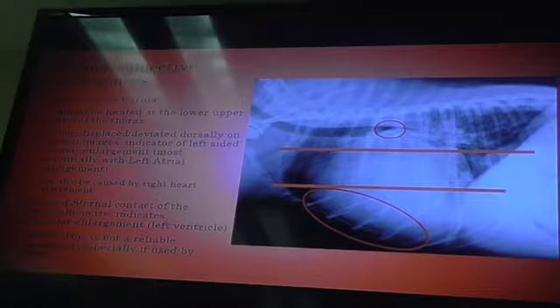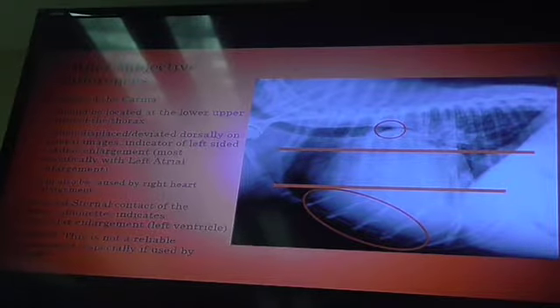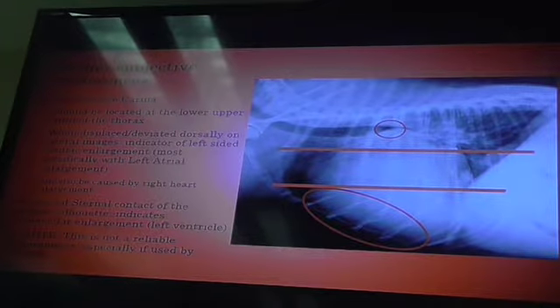So if I were to describe this, it would say there's dorsal elevation of the carina, loss of caudal cardiac waist with increased sternal contact. Okay? That's indicative of left-sided heart disease. So I have left atrial and left ventricular disease going on here. I just gave you a lot, but that's okay. Because by the end of this topic session, you guys will be good. All right. So we've gone through most of these parameters on how we're going to describe things.